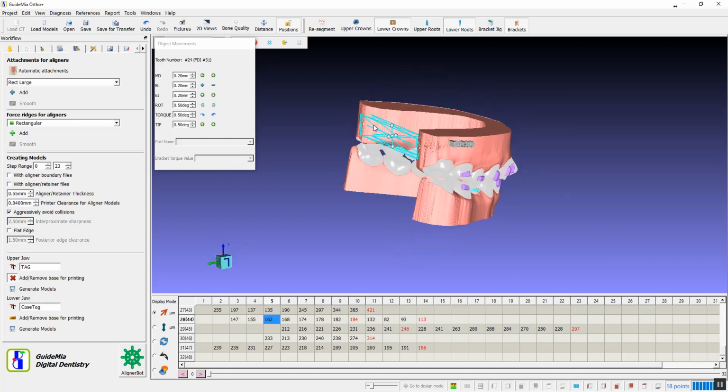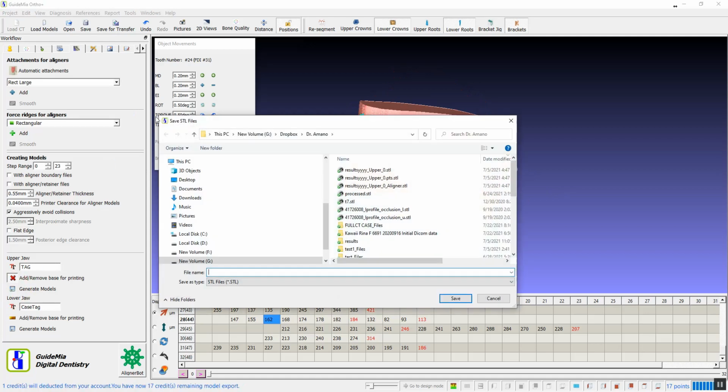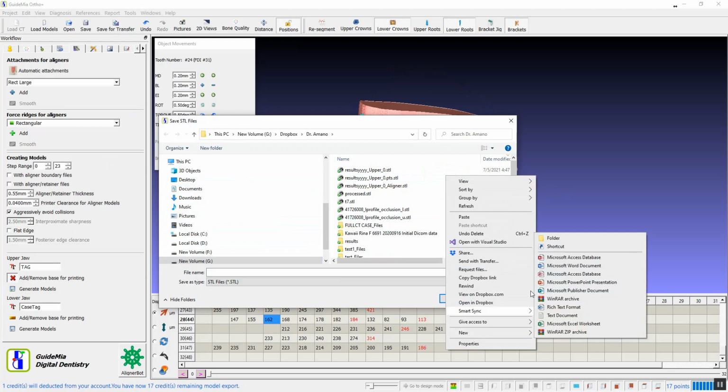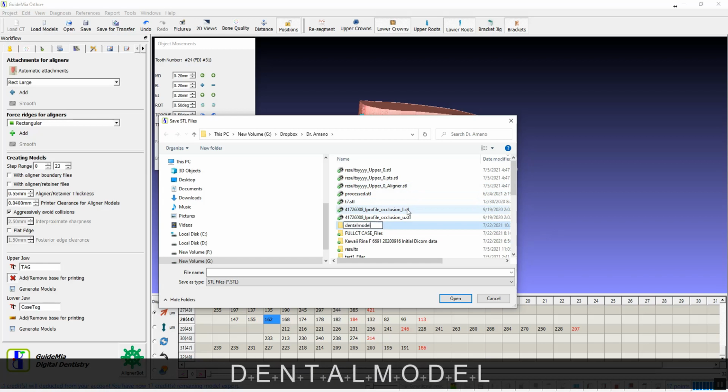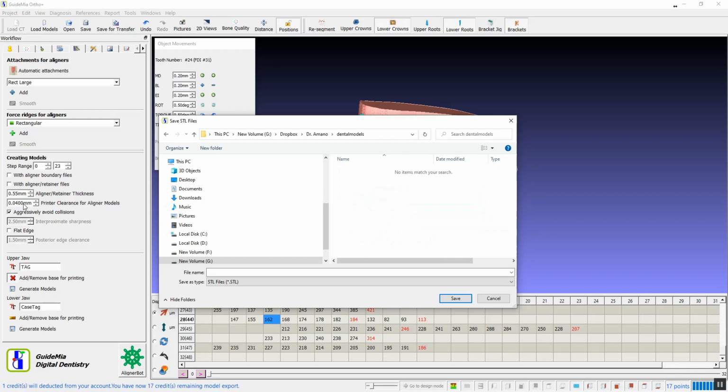After all of this, click the Generate button. The system will generate all the files. Another option here is to avoid collisions aggressively during the model generation process. It is sometimes not completely clear to the user if there are collisions in the intermediate steps. This option will help avoid collisions. At the end of the operation, the system will pop out a message with such information.